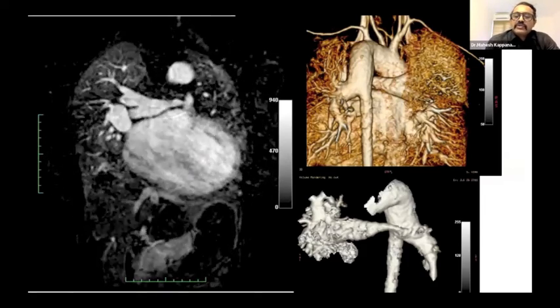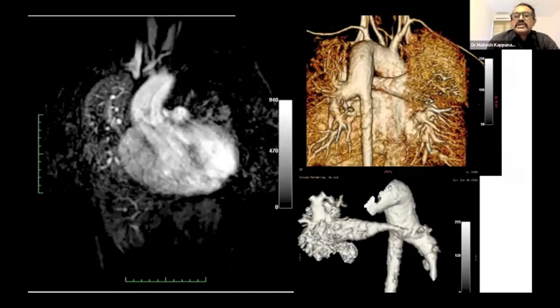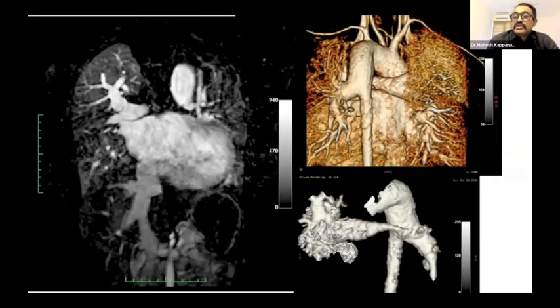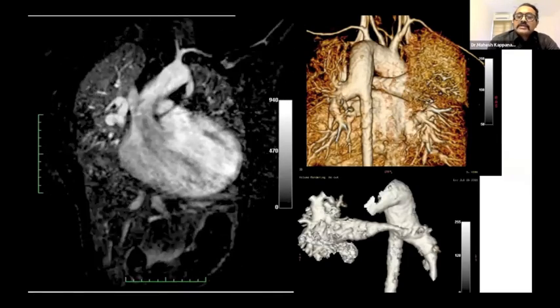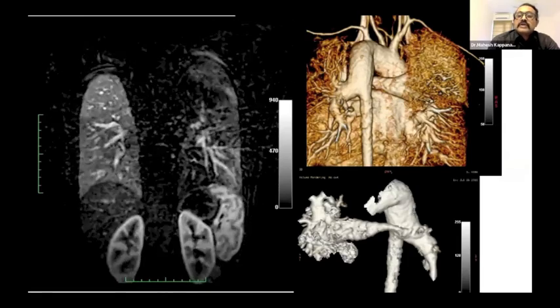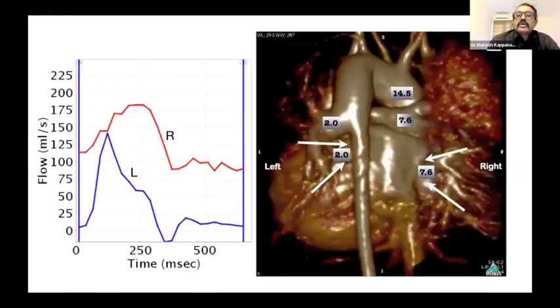In this angiogram, you're not only able to see the anatomy, but you're also able to see the pulmonary vascularity. You can see that the lung with the unrestricted pulmonary blood flow shows evidence of increased pulmonary vascular resistance, whereas the pulmonary vascular bed is much more perfused on the right lung, which has a restricted MAPCA.